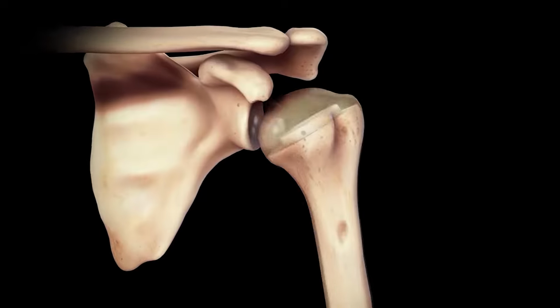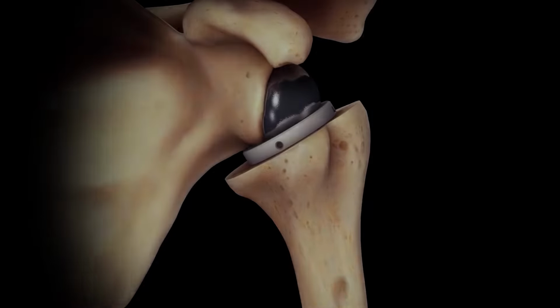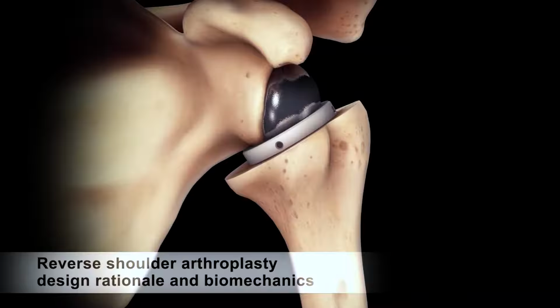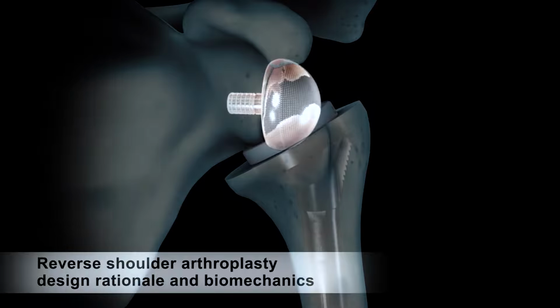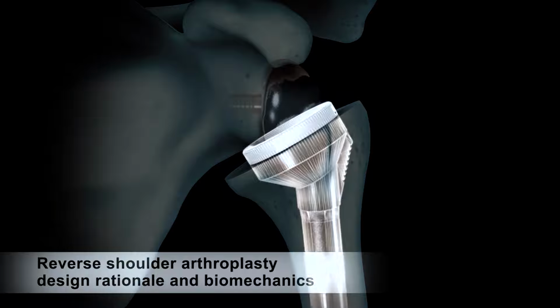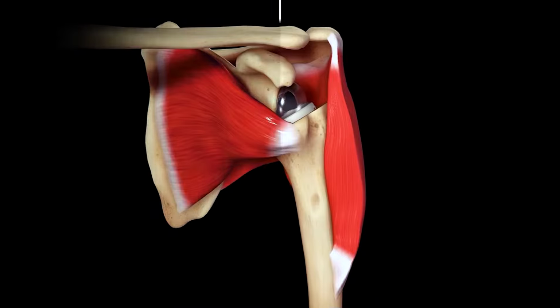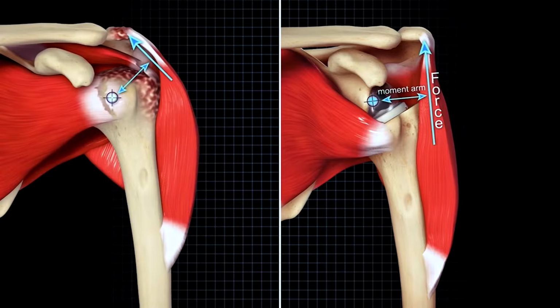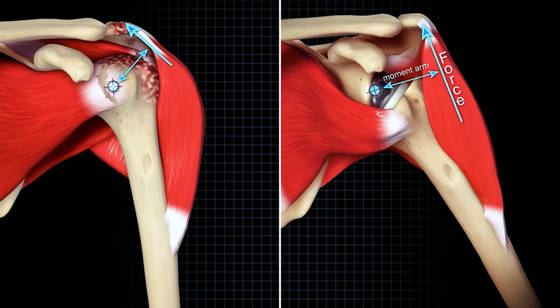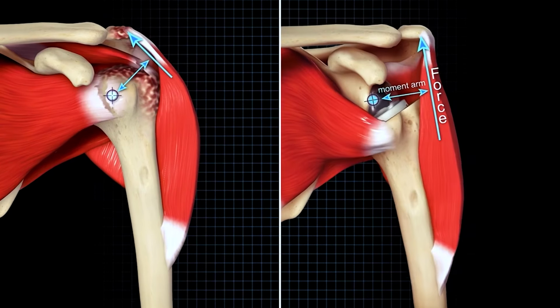The standard of care for CTA is reverse shoulder arthroplasty. The reverse shoulder prosthesis inverts the anatomic articulation, making the glenoid convex and the humerus concave. Inverting the concavities restores stability by creating a fixed fulcrum that prevents superior migration, facilitates the deltoid to elevate the arm, and limits motion to only spinning.